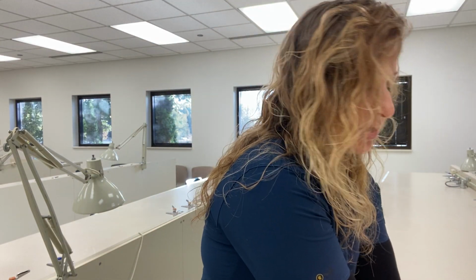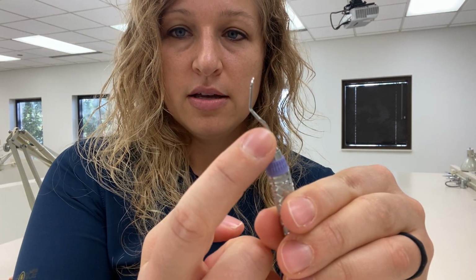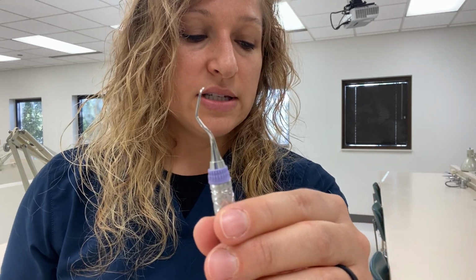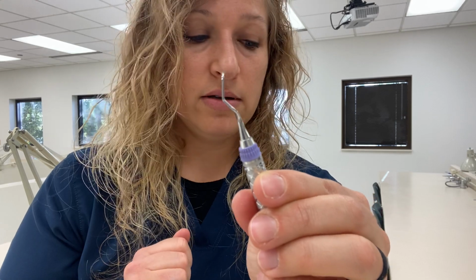And then with the lower or the terminal shank, this one gives a good example of a longer terminal shank. That terminal shank is the portion right here that we were talking about before you get to that blade or that working end. It's nearest to the working end. It's going to help you select the correct working end, just like we did with the Explorer. It's pretty similar to that. You're going to want this terminal shank parallel to the long axis of the tooth.